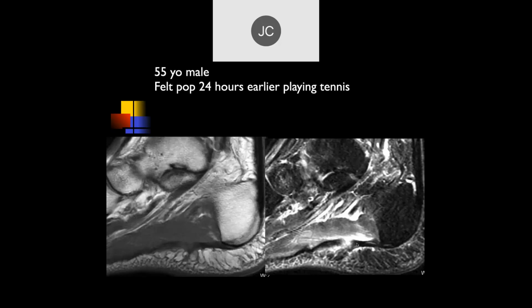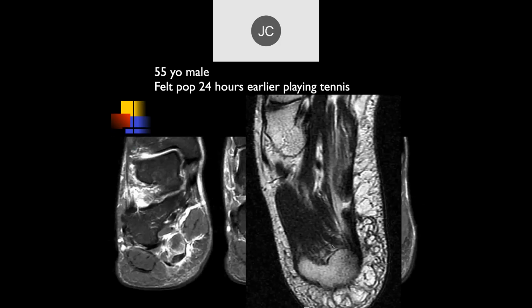And here you can clearly see a nice tear, full thickness, with relatively sharp margins, so there's fraying of the distal ends of the tear. We can see that there's some thickening on either side, so this again is not a normal tendon. It's a tear which is occurring in a tendon that's already thickened with tendinopathy.